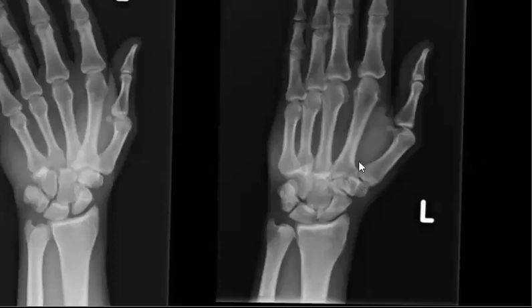So the clue for you is to draw this exact line in the checklist, when you go to check the metacarpal joints. When you find this exact line is disrupted, sometimes it's just disrupted in the fifth or the fourth, but here it is disrupted from maybe the third until the fifth. This is what is called metacarpal dislocation.